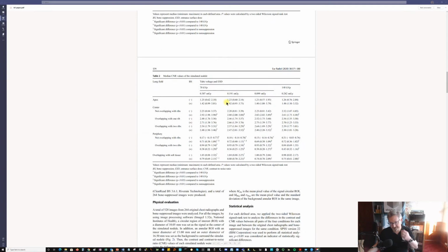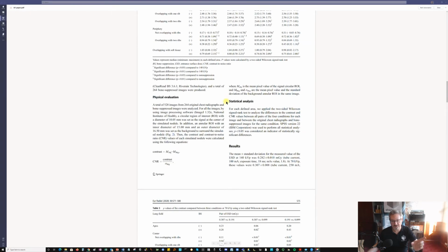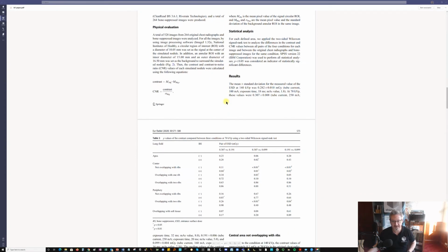So this video looks at a group of second year radiography students having read this paper and having discussed how the experiment could go in previous weeks. This was the session where the experiment was repeated using ProjectionVR simulator with the help of a tutor who happened to be me on this occasion.